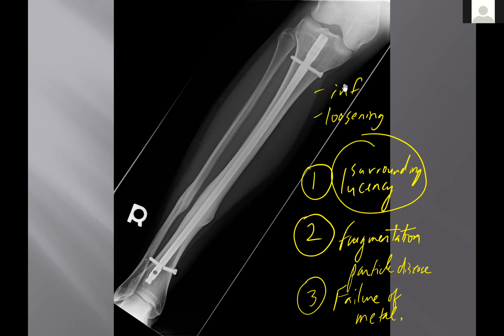But I do think, because of the biomechanics, because of the motion that occurs at the ankle mortise joint and the stress on the interosseous membrane, if the guy goes back to a lot of activities, there could be some stress here that fractured the screw, and they may need to remove the screw and see if that does the job. But I agree. The only reason this would be removed is if 20 years down the line, the guy needs a total knee replacement and they want to get rid of that thing. But boy, I wouldn't want it removed.